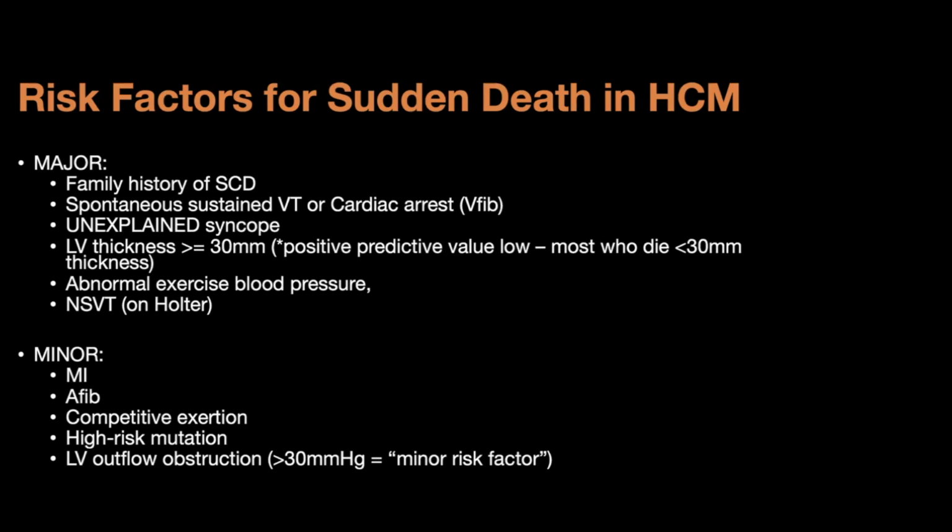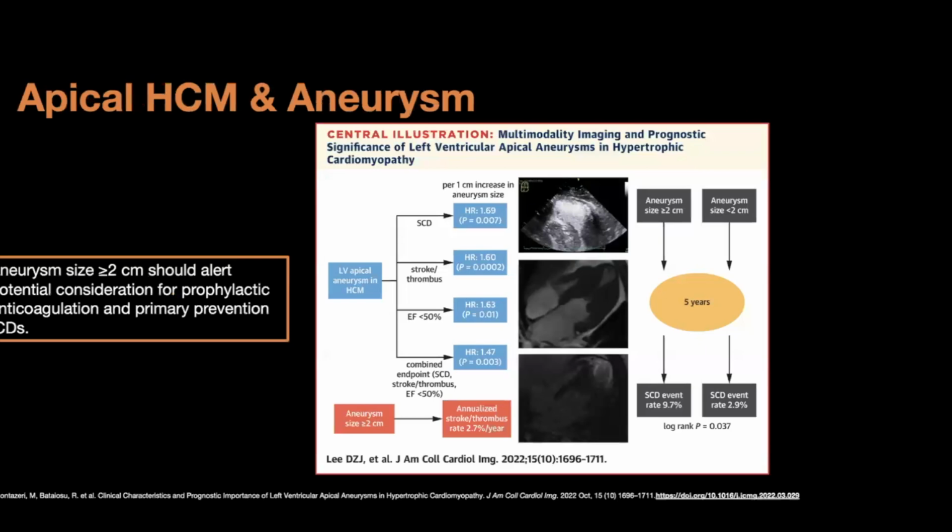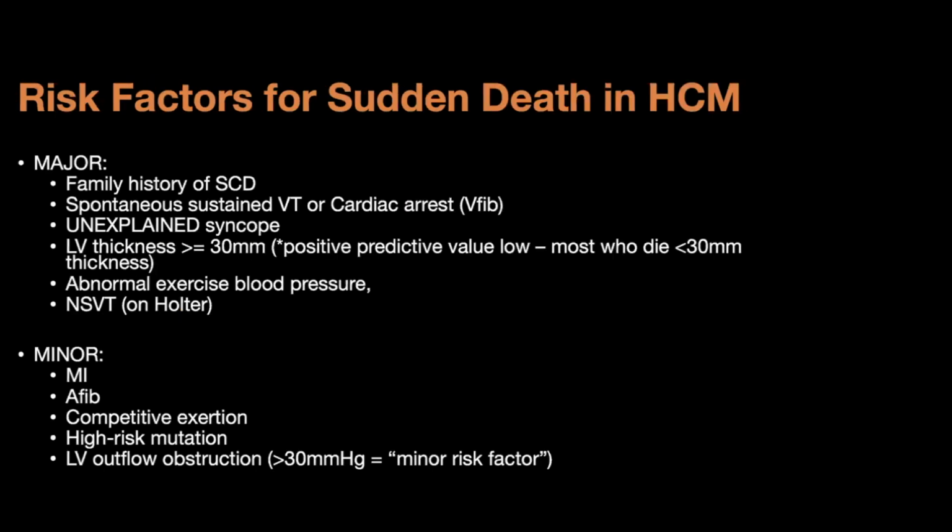Yeah, I think we just didn't visualize it well. It's one of the important differential diagnoses. The prognosis of such patients is much better than true patients with HCM. We have similar findings when patients show up to our office. They have a very abnormal ECG, and then in the echocardiogram, you often see the lack of space in the apex, but it doesn't typically have the diastolic spade shape.